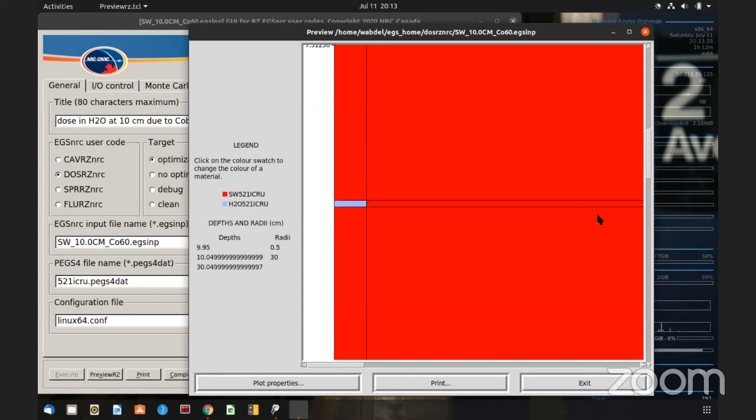Okay, because does 9.6 attenuate the beam or give you the same dose as in water if you actually put 10 centimeters of water or not? This is what I want to actually establish. So that's why I have to do it this way.